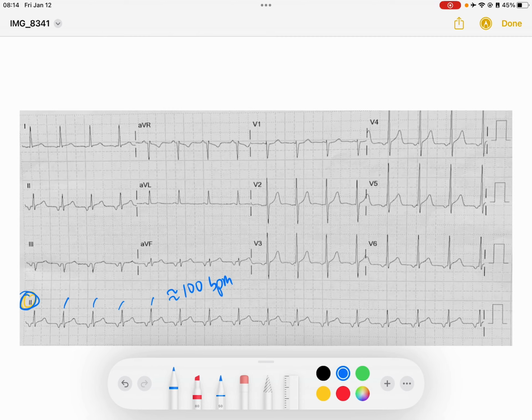And so what we can now do is say, okay, we've got this tachycardia. Let me figure out, one, we know that this is a narrow complex rhythm. So we know it's likely coming from the AV node and propagating down into the ventricles through the His-Purkinje system. And so now we figure out, well, what is my atria doing?